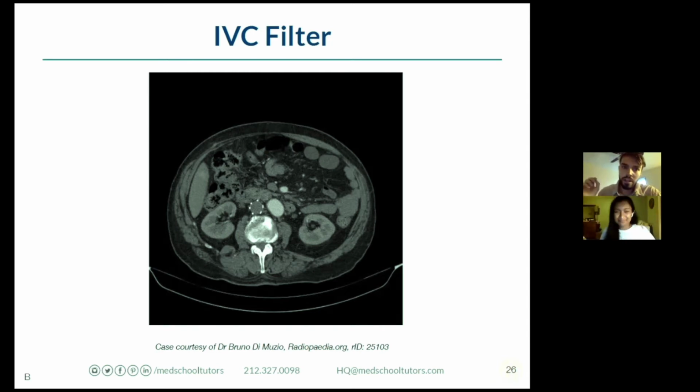I remember my trick as a non-radiologist, that the darker thing's probably going to be the vein. And then, as you say, I have these evenly spaced things. If that didn't click the first time, which is very possible, then I'll glance quickly and go to the vignette. I'll trust myself going to the vignette, and then I'll probably think that this person maybe has blood clots and a reason that they can't be anticoagulated because they may be bleeding. The treatment for that would be an IVC filter, and then I look here and I confirm that. So you don't have to be a radiologist to get these questions right. Absolutely. No, definitely not.